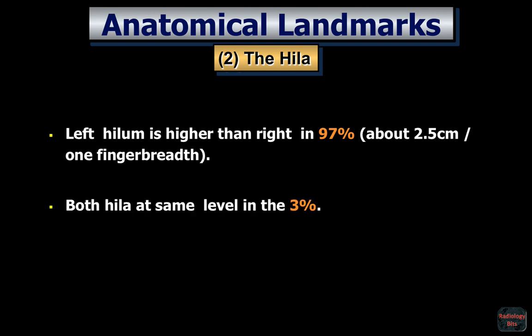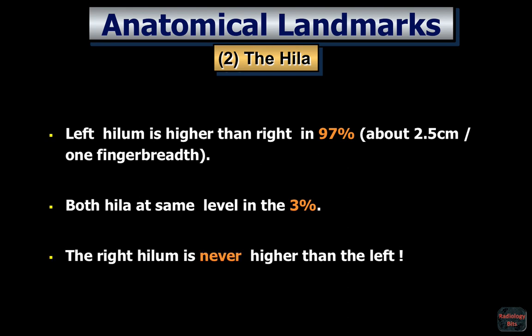Now, in the remaining 3% of the cases, both hila may appear at the same level. However, remember that it's never normal for the opposite to occur. It's never normal for the right hilum to be higher than the left.